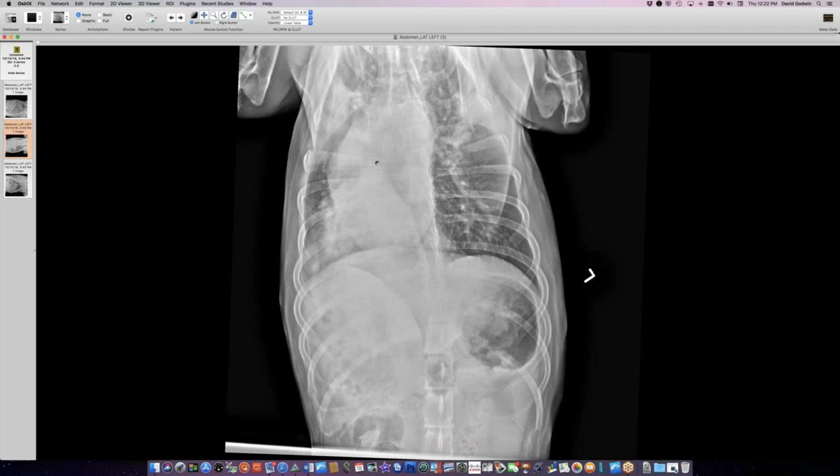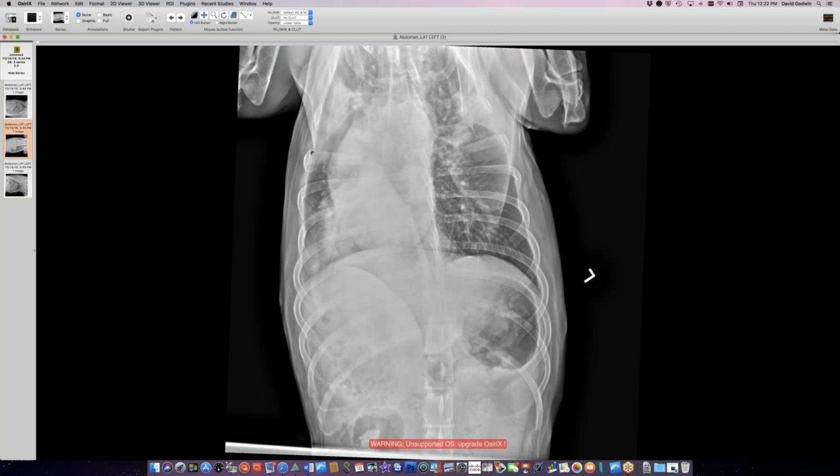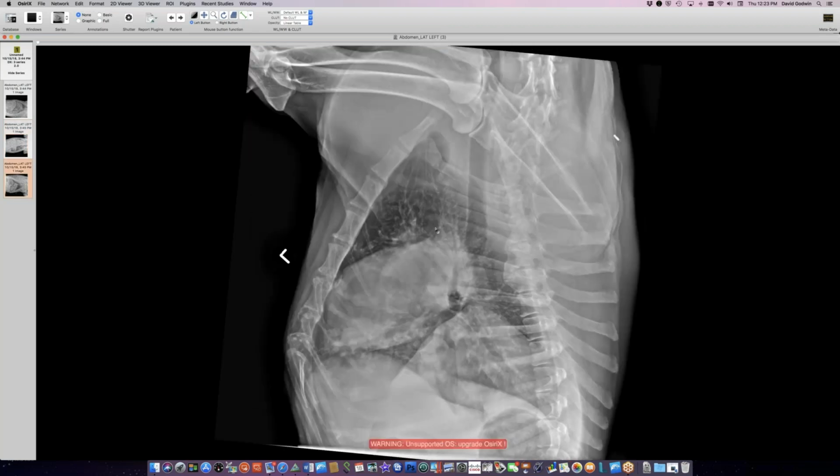This is one of our office statistician dogs, which is 17 years old. And I think there's a nice lower lobe collapse pattern here. Now, dogs have a cardiac lobe, which in humans corresponds to the medial basal segment. So the medial basal segment is a separate lobe. The inferior accessory fissure in humans is complete in dogs, and it gives rise to this lobe down here. So this could be a cardiac lobe. It's a very nice triangular shape down here.